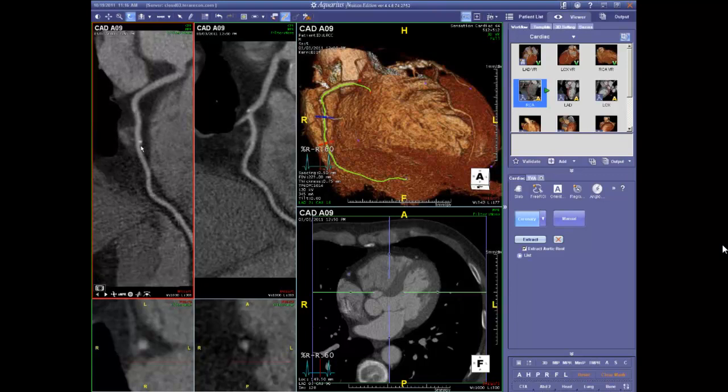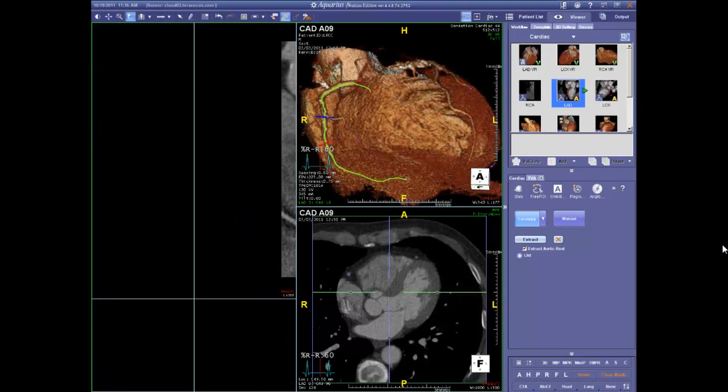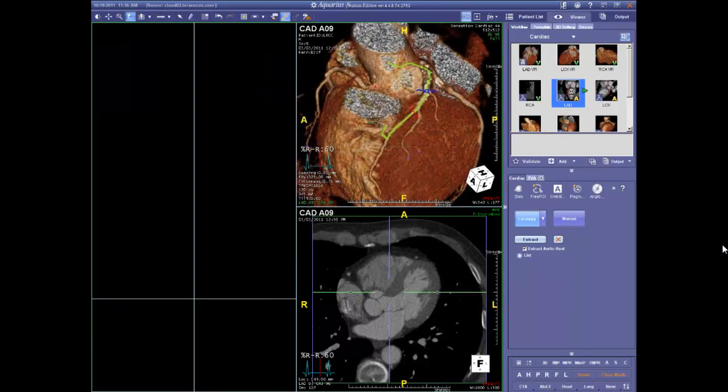It's certainly disease, but it's not bulky. There doesn't appear to be any associated soft tissue density that would indicate non-calcified plaque. So this would be a focal proximal right coronary artery calcification only, but probably of a non-obstructive nature. In fact, almost certainly of a non-obstructive nature. So let's go ahead and jump to the next vessel, which is the left anterior descending.